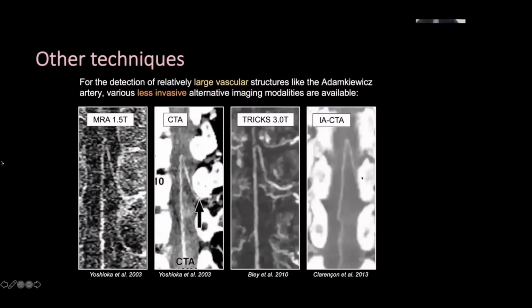Just to show you that our technology is getting better at cross-sectional imaging, we can use CT angiography and MR angiography to depict a lot of these vascular structures, which were only really feasible using angiography. Nowadays, what we'll typically do if there's a clinical suspicion of, for example, a dural AVF, we'll perform an MRI and an MRA first.